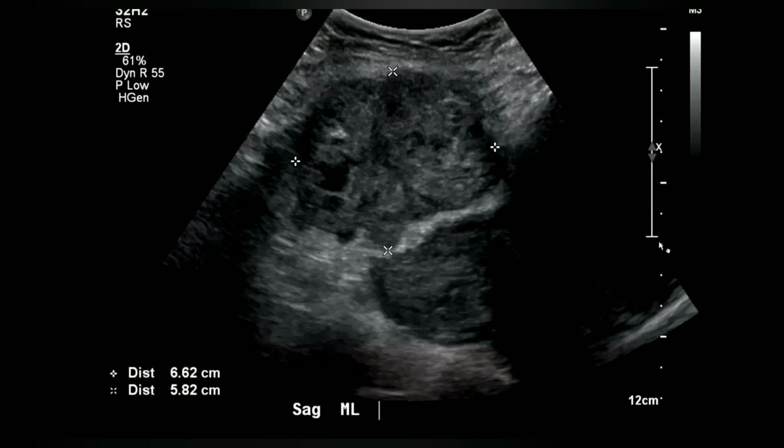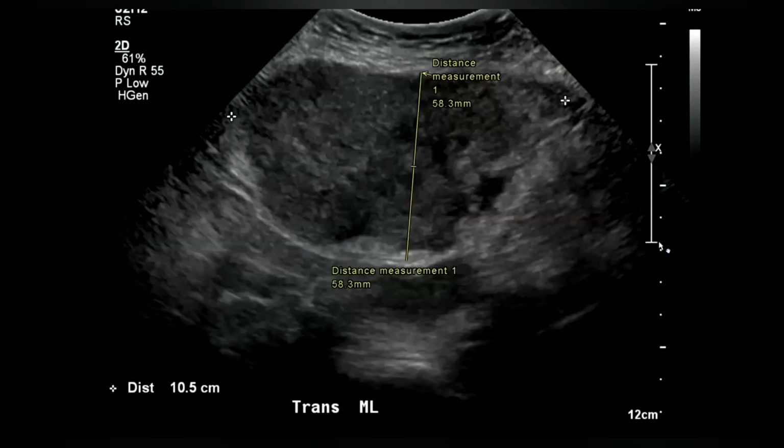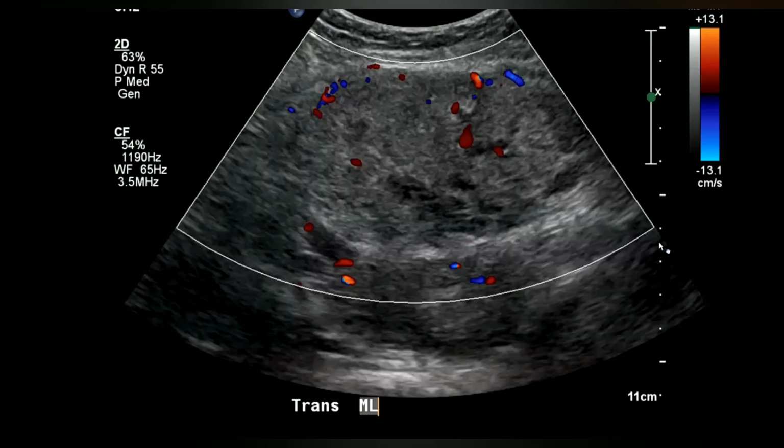There is a large lobulated hyperechoic lesion with multiple anechoic areas within it, and it is within the uterine. Sorry? Cavity. This is the uterus, this is the urinary bladder, and this is present superiorly. I told you she had a cesarean, right?